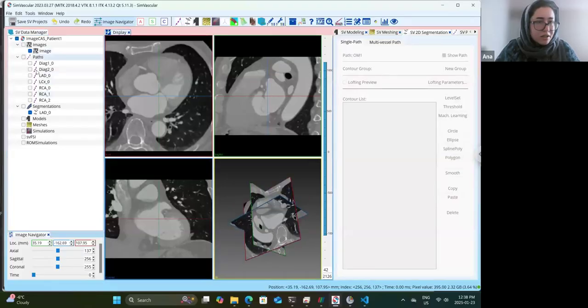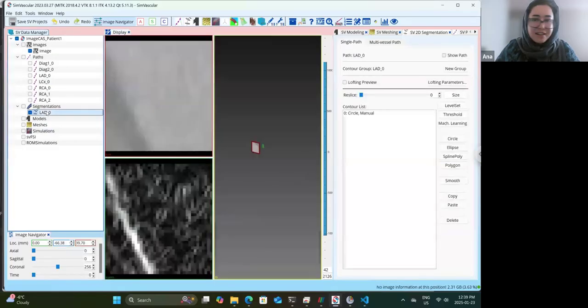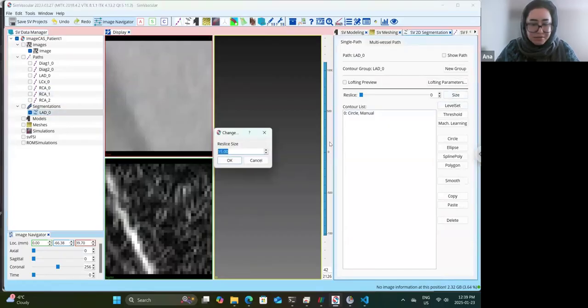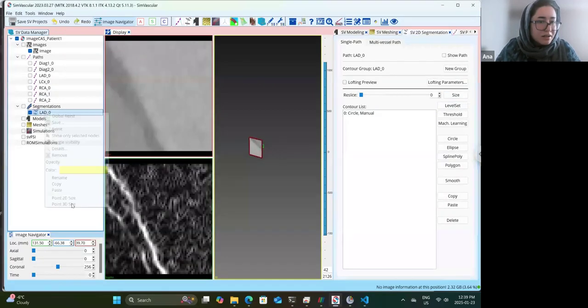So what I see here is that I do believe that Dr. Khan segmented this out, but I just see one segmentation right now here. All right, we will continue from here. It might be a little bit boring for you because you already have done the segmentation.